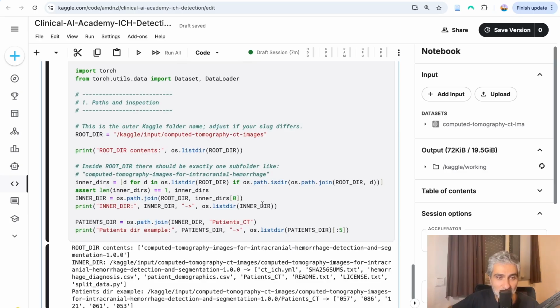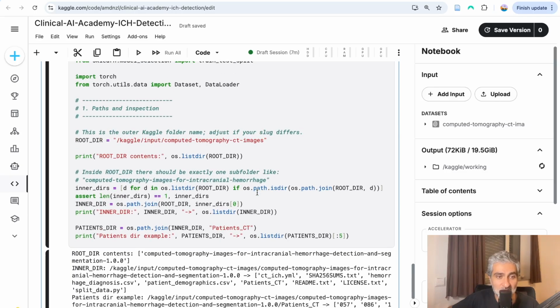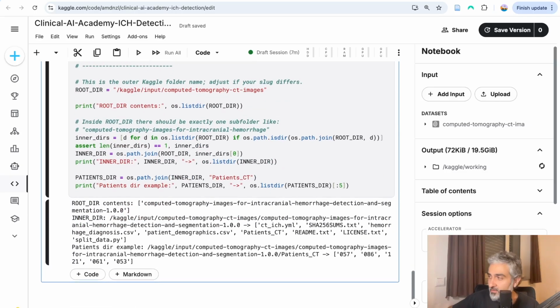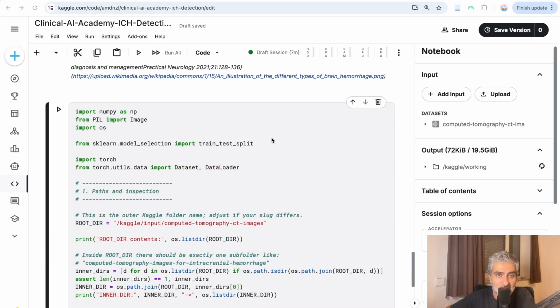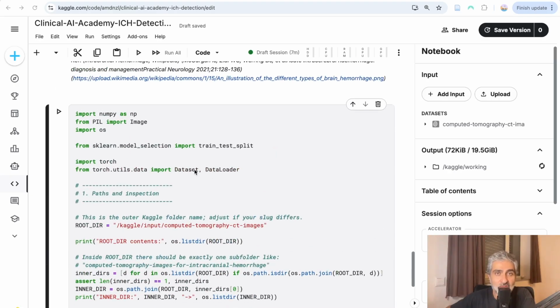We have the dataset in the working space, and we can now work on it and start building the structures that the model will use for training. Those are what is referred to as the dataloaders and dataset functions.